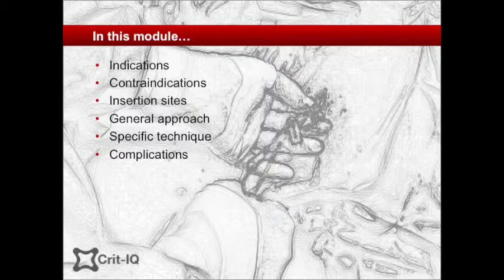In this video, we will review the indications, contraindications, and insertion site-specific considerations for the insertion of central venous lines. This is core knowledge for intensive care practitioners.